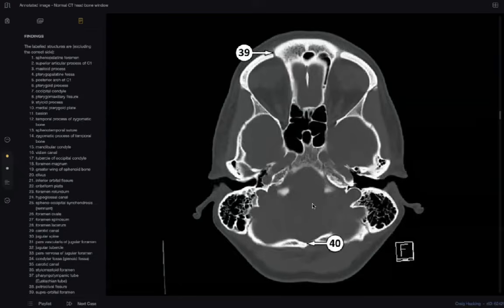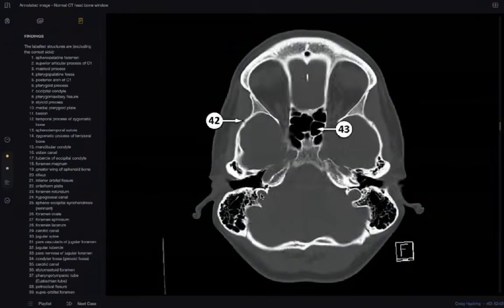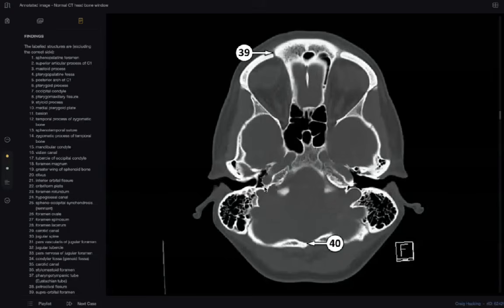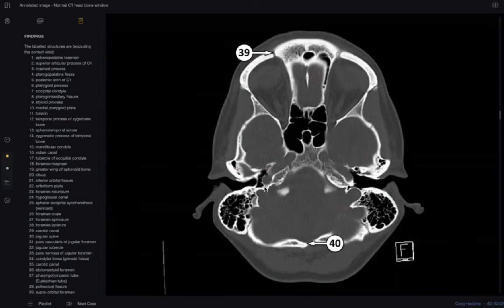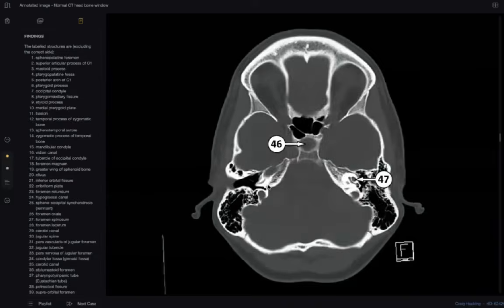Okay, my colleagues. This is the carotid. Posterior to it, this is the jugular. Between both of them, carotid and jugular, there is this one, a bony septum. It is very important because with this septum you can diagnose many diseases. Okay, my colleagues, very important.